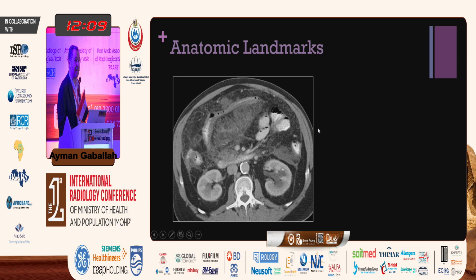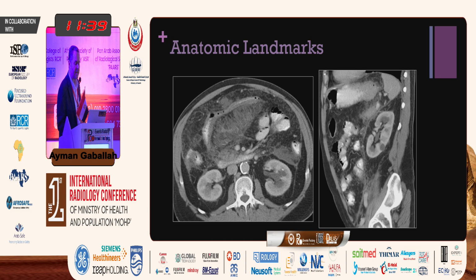And here is one CT image from a case with acute pancreatitis. You can see here is part of the parietal peritoneum, or the root of the mesentery, that separates the peritoneal cavity from the retroperitoneum. You can see the perinephric fascia that separates the perinephric space from the anterior pararenal space. And here is part of what we call the pre-peritoneal space. Hopefully you can see that clear fat and the thickened part of the peritoneal reflection anteriorly. This sagittal plane shows the thickened perinephric fascia as well.